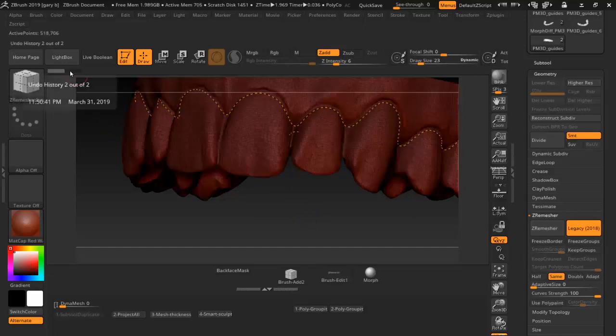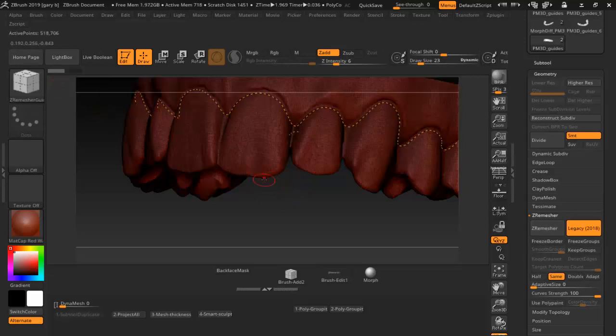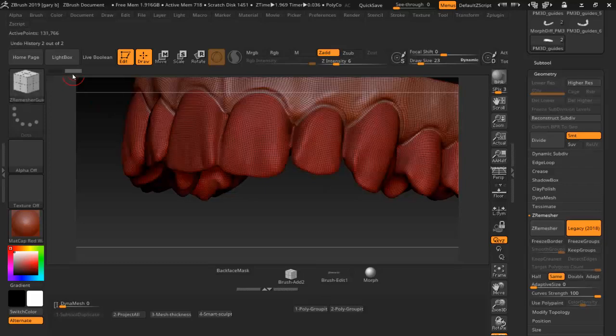Alright, the reason why you don't want any shrinkage and jumping around is because you want to cut this thing exactly where it's supposed to be, and we want it to fit the teeth like it's supposed to. So basically, if I was switching this back around and I noticed this tooth down here was getting larger or smaller, we have a problem somewhere. Or if this line is jumping up and down and not meeting these two lines, we're also going to have a problem. But as far as I can see, this thing is working perfectly.